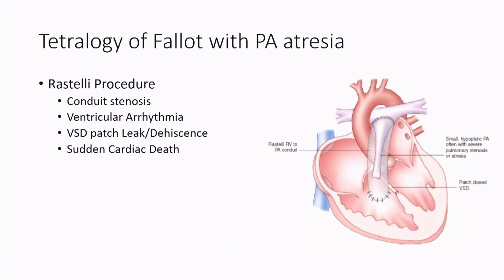So the report said that there's a subvalvular pannus with an area of calcification resulting in restriction of the anteromedial mitral leaflet, and also the VSD was known, and so it was diagnosed to be a pannus. So one of the key parts of CT is to differentiate between a pannus and a thrombus.